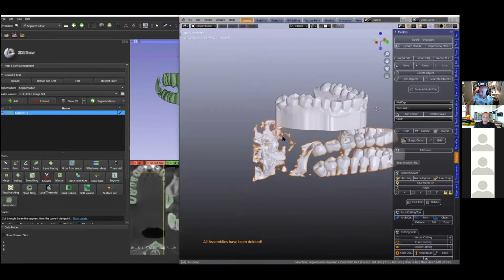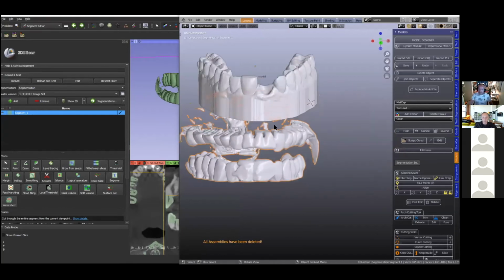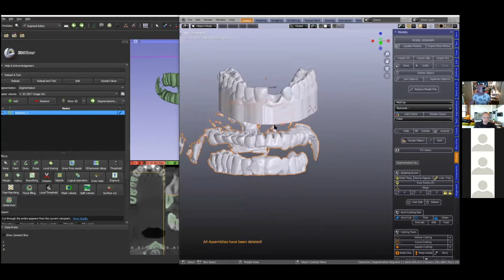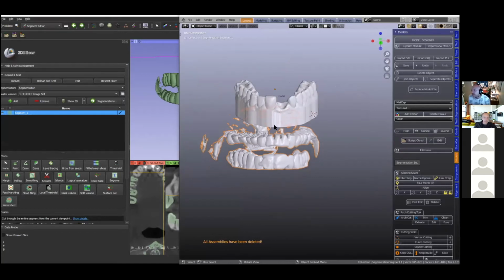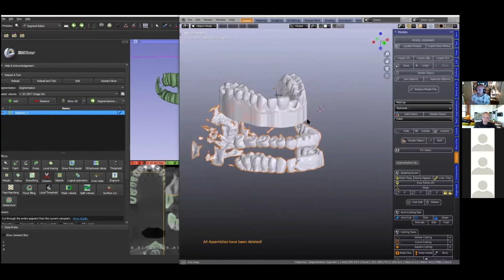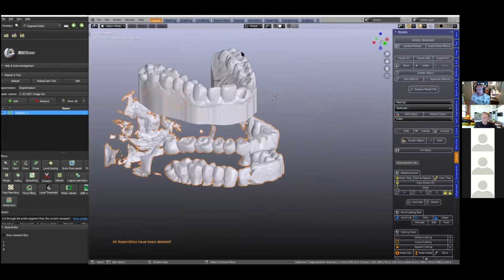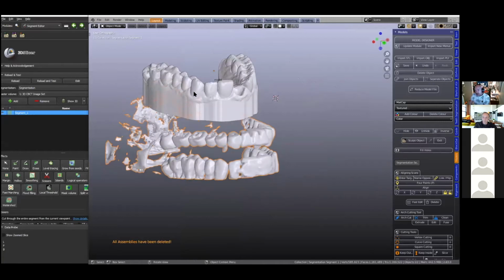So, Michael, can you just explain to people what is the purpose? Why is the workflow this way? We're importing a small segmentation model to align the dental model with the CT scan coordinates. Yes. So if we take our model, which we've designed earlier, and align it to this, we know that the model is in line with the DICOM.